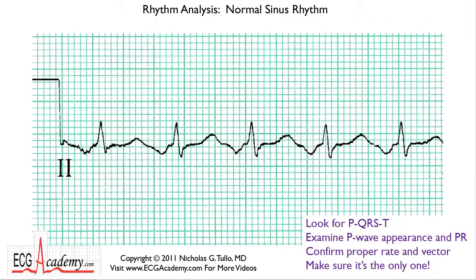Okay, so let's get some more practice here. Now here's a patient. The first thing you see is, it looks a little bit funny. Of course, the biggest signal here is the QRS complex. Okay, so we can label QRS here, and we see that it looks pretty regular. But what's the rate? Now this QRS lands near a heavy line, so let's count backwards.